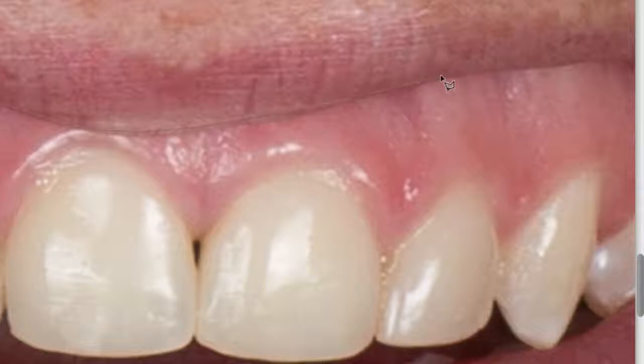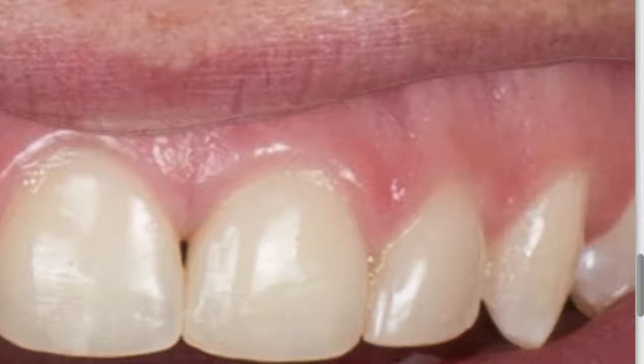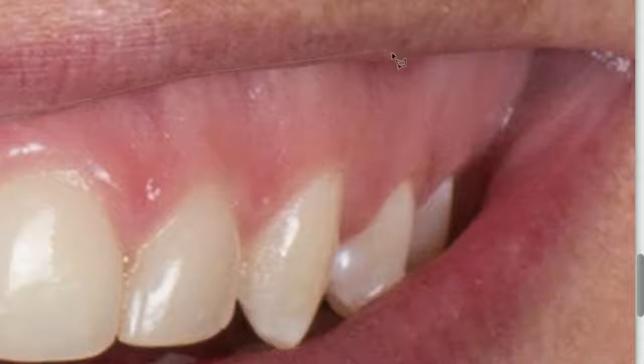All right, so this takes about a minute or so. Sorry for the boring minute. And we're going to come along and select a pixel or two just inside here, and if we don't like that, if it's a little bit too sharp of a transition, to back up I click the delete key and that will get rid of the last point. All right, so we're coming down here.